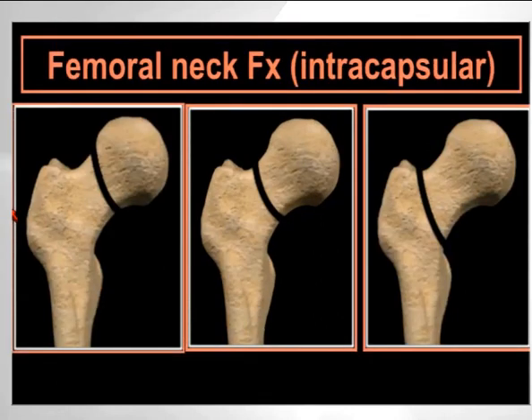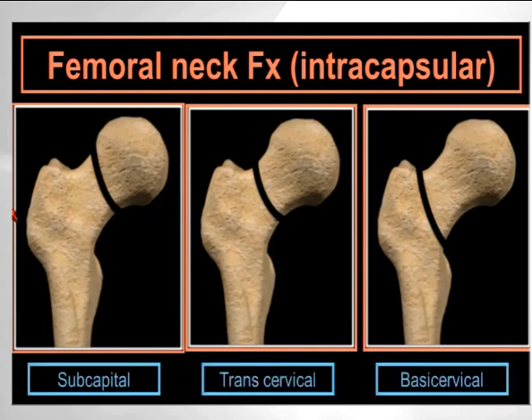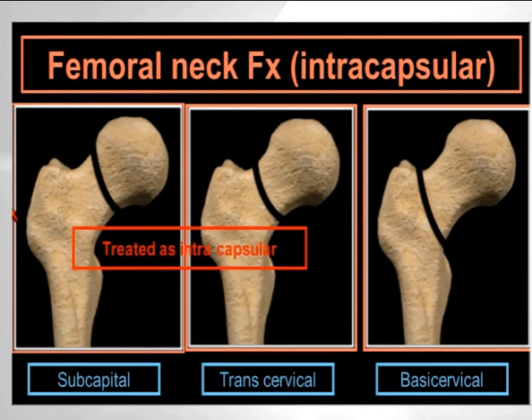Now, intracapsular femoral neck fracture comes in various flavors. The most common is subcapital. Transcervical is very rare, and basicervical is extremely rare. Now, the importance is when you have subcapital and transcervical fractures, they are treated as intracapsular. But if you have basicervical, that's treated as extracapsular.